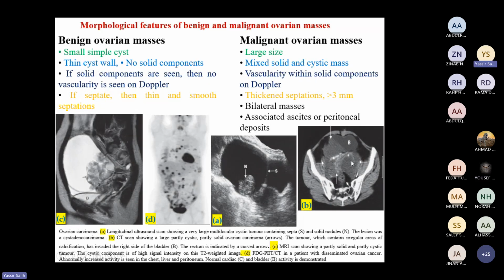Doctor, how do you know it's in the ovaries from that image? From one section it is difficult. You can follow it by scrolling with the mouse, in CT you can see all the slices. You can follow the uterus from right to left and from superior to inferior, and you can see it in coronal.